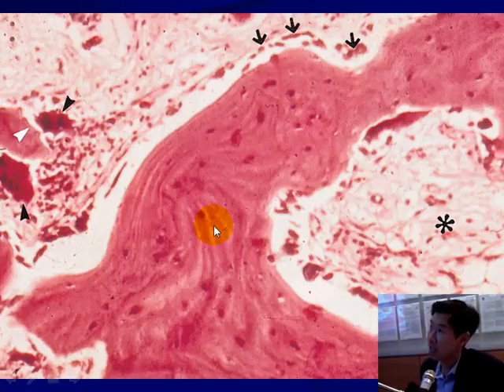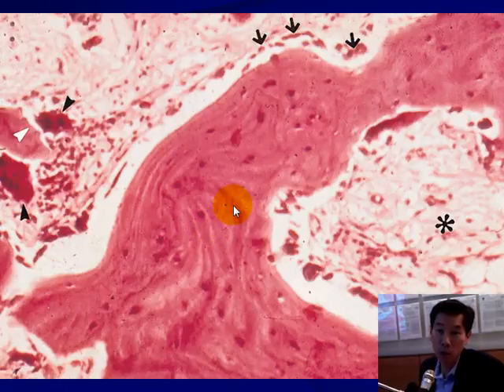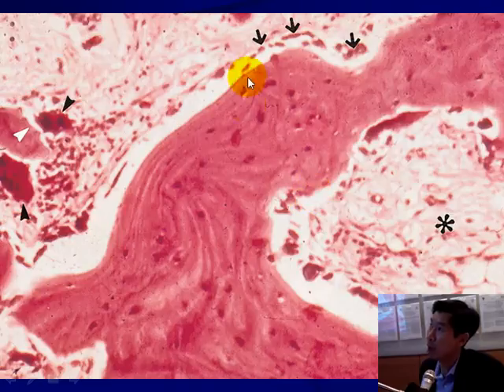So this is an example of the mixed phase, where we have both bone resorption and bone repair. These are giant osteoclasts. These cells are the osteoclasts which are taking away the bone, the culprit for the lytic bone. These are little osteoblasts that are trying to lay down new bone that's formed.